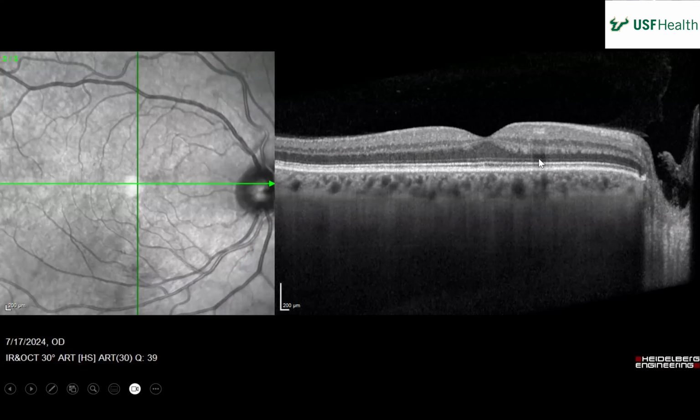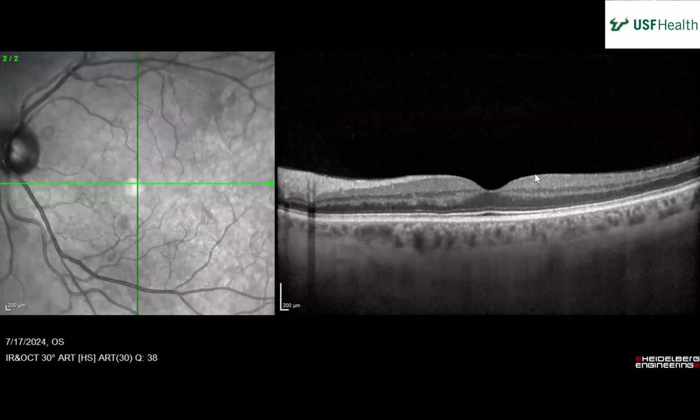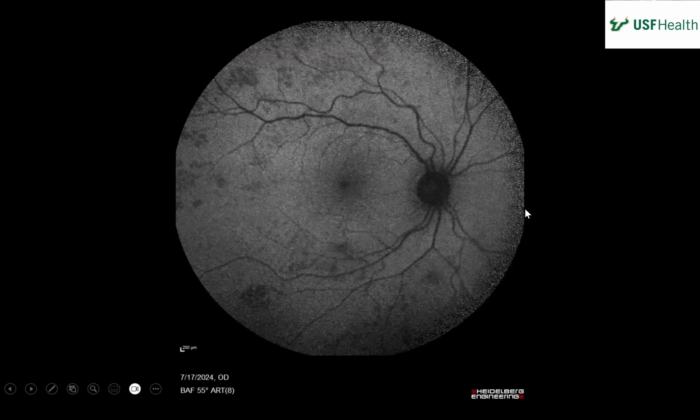What do you think that is? Do you know what that is? That's sort of a funny looking lesion, that white spot, the little rectangle there. Could it be like an exudative area? Probably. I mean, that's a vessel. Yeah, it's a vessel. If you cut a vessel, if you don't nail a vessel, you get this funny looking white line on your OCT, so you look at it like, oh my God, what's that? It's like, oh, it's just a vessel.